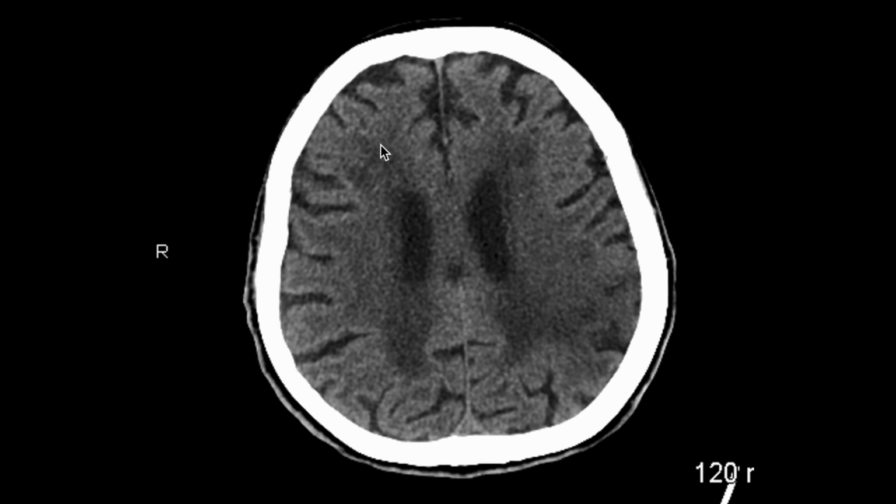Now, whenever we have loss of the gray-white differentiation, that usually suggests that there might be some element of cytotoxic edema, and cytotoxic edema suggests to us that it might be ischemia. So if you take a look here, you'll see nice gray-white differentiation, but then when you reach this area here in the left parietal lobe, we see blurring of the gray-white differentiation, and we have essentially loss of the gray-white differentiation. This is a left parietal stroke, and this is usually MCA territory, and we have a stroke right here in the left parietal lobe. And our clue for that is the loss of gray-white differentiation.